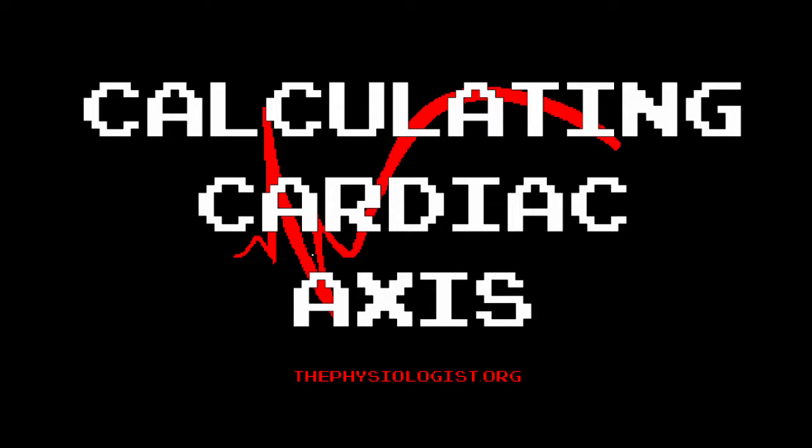For this tutorial, we're going to go through how to calculate a cardiac axis from a 12-lead ECG recording. This isn't a difficult thing to do, but when you're starting out, it can be quite confusing. There are a lot of different steps involved, a lot of concepts behind it, and if you want to get the correct result, which is very important, you have to know how all of these things work together.